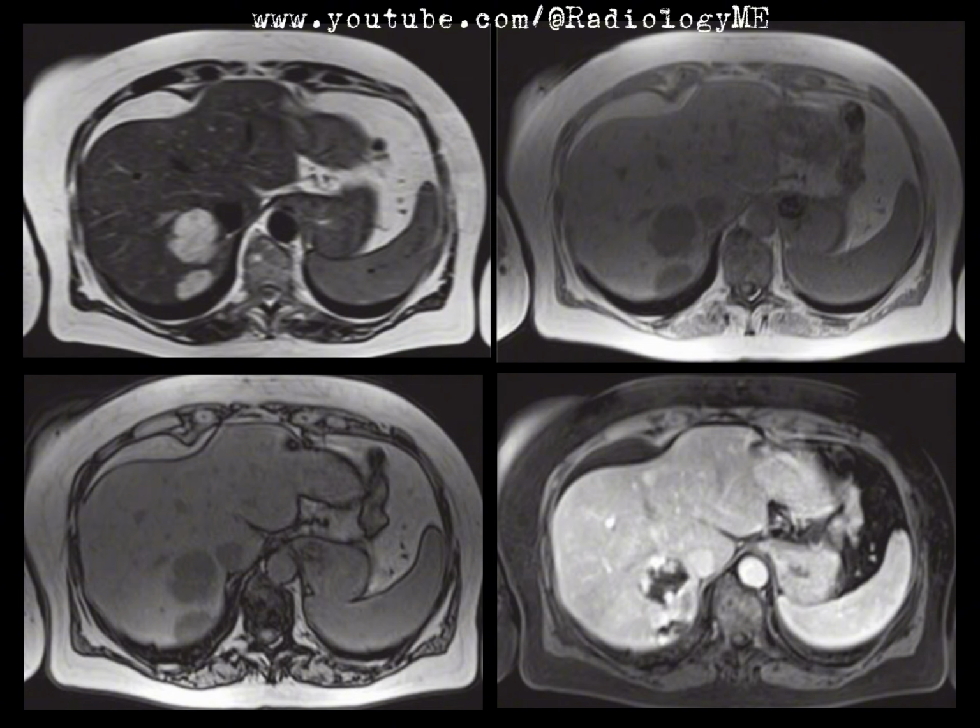These findings are highly suggestive of benign cavernous hemangiomas, given the rounded, well-defined nature of the lesions and the characteristic enhancement pattern. To further reinforce the diagnosis, the background liver tissue appears completely homogeneous with no signs of cirrhosis. This is crucial, as focal lesions in a cirrhotic liver could have a much broader differential diagnosis. Importantly, the spleen is not enlarged, which makes conditions such as portal hypertension less likely.